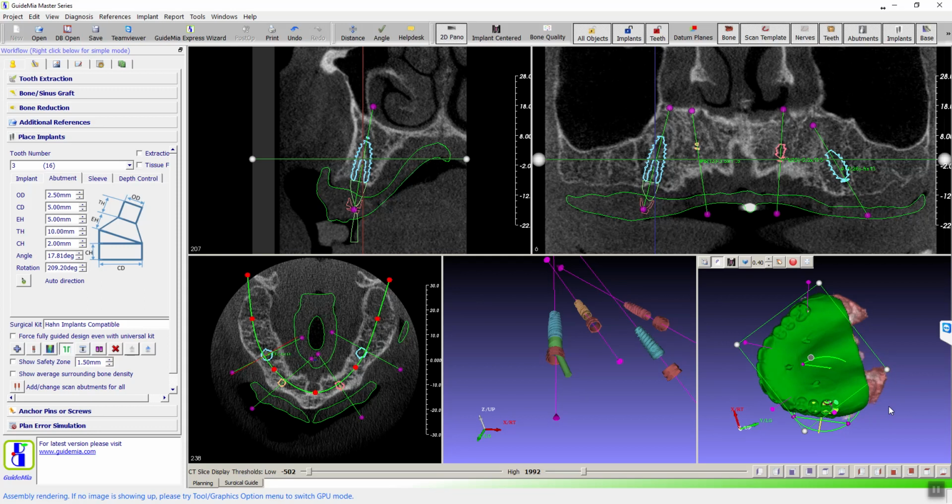But the glass of your computer screen is here, and the occlusal surface of the teeth is in the same direction as the glass. Right. So wouldn't you always do that on top of the guide? How do you do that without the guide? I think the only purpose for this is to calculate the precise angle for that freestanding abutment. Yes, for an abutment. To make sure I'm choosing angles based on the teeth.